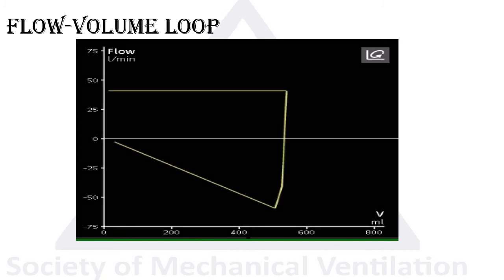so expiratory flow, let's freeze it here, basically goes down to zero before the next breath, as you can see here. Now we see the difference when we try to make our patient a COPD patient with a high compliance and high resistance.